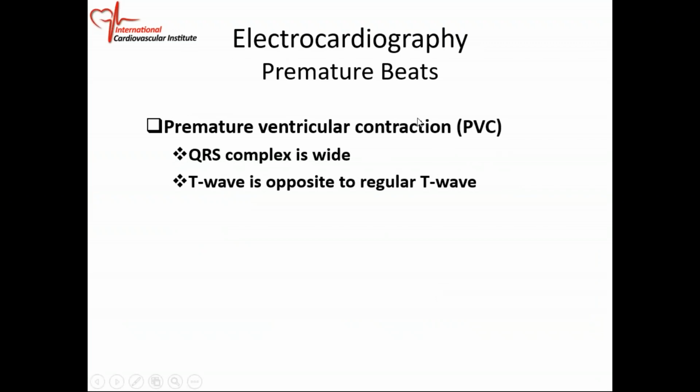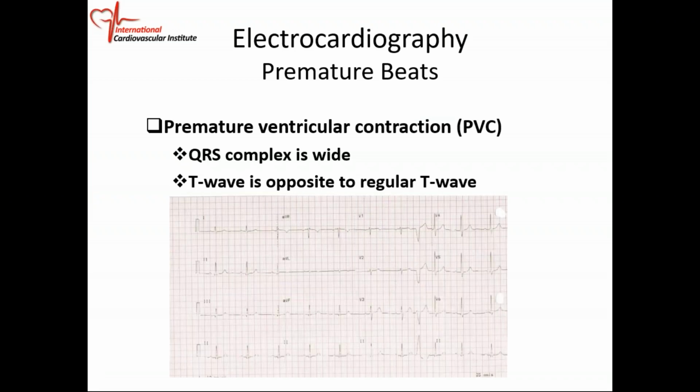When we talk about premature ventricular beats now, that means a beat originated in the ventricle and it came a bit early. So this doesn't project very well. It's very light, but look at the bottom of the rhythm strip. You have P, QRS, P, QRS, P, QRS, and it repeats itself. The R intervals are regular, they're regularly spaced, and then this beat came early. This beat came early.